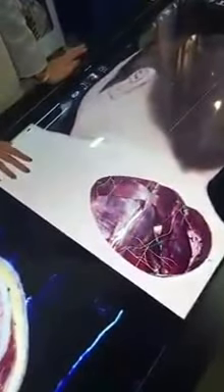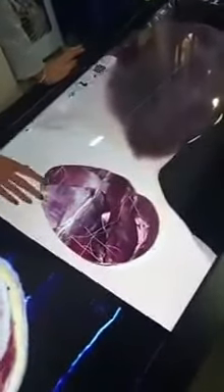To mimic something that you find in surgery, you can also do natural cuts. So in this case, I have an incision made, and you can also see the relationship between the skin, the fat, and other structures. And as I showed earlier, you can go ahead and also remove structures here and press this undo button. And what's interesting is these are actually the scans that were done from the cadaver.